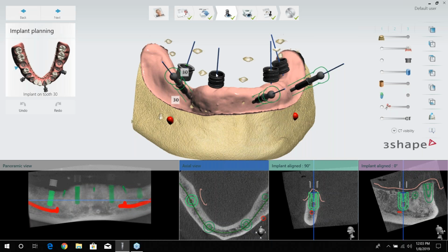But generally, I would think the closest you can get is better, because it keeps the height of the guide down. It leaves you more room for the surgery. If you have something really tall, especially in the posterior, it's going to be hard to get the drill in.